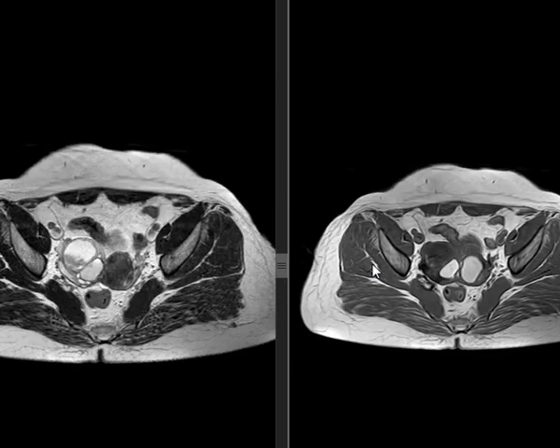So let's come to the first lesion, which is this one. On T2 it appears what? It's high on T2 and low on T1. What about this thing here? This is high in both. Suggesting maybe fat content. Now, what about this one? It's high in T1 and low in T2. This indicates blood content.